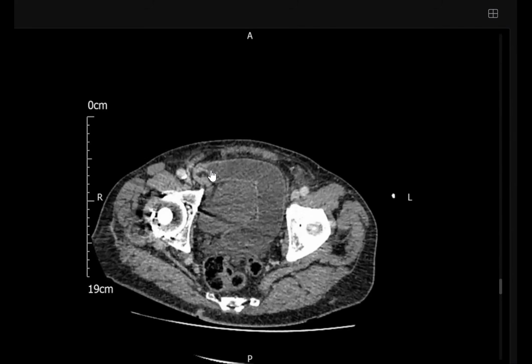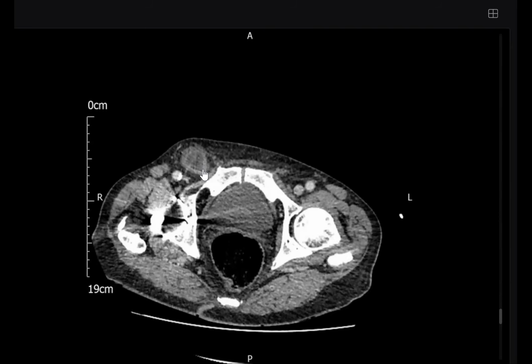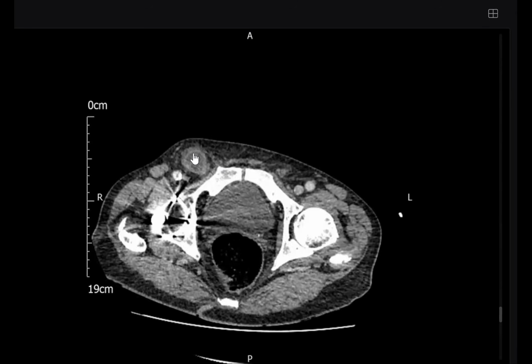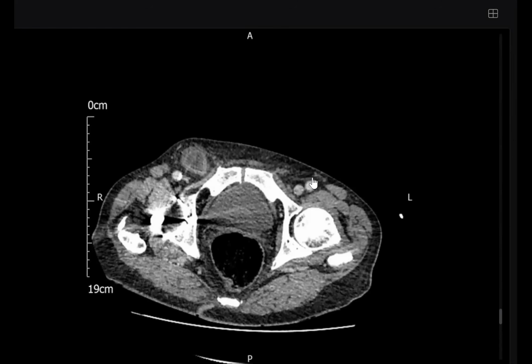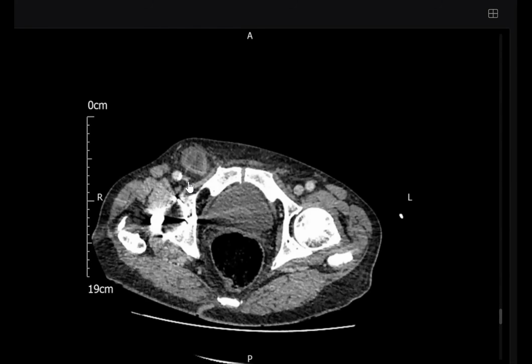Now to the transition point. This is the transition point. So it's a hernia. Okay, what type of hernia? It's a groin hernia. You see this part. It is not medial, it's lateral. Okay, lateral means what? See the vessel here and here. Artery, artery. Vein, where is the vein? Where is the femoral vein? Collapsed. Right, collapsed.